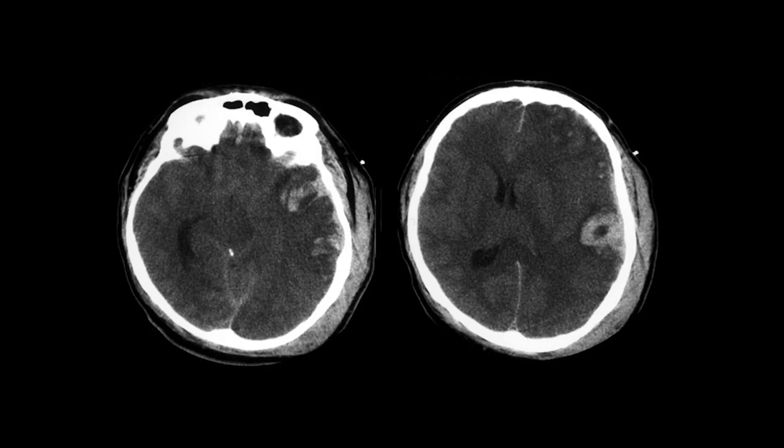And here is a patient with multiple left frontal and temporal contusions and effacement of the cisterns, left to right subfalcine shift, trapping of the right lateral ventricle, and complete loss of the perimesencephalic cisterns and generalized brain swelling. So these are secondary injuries.